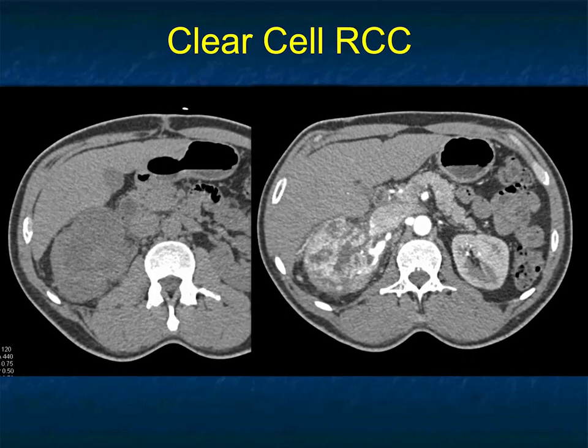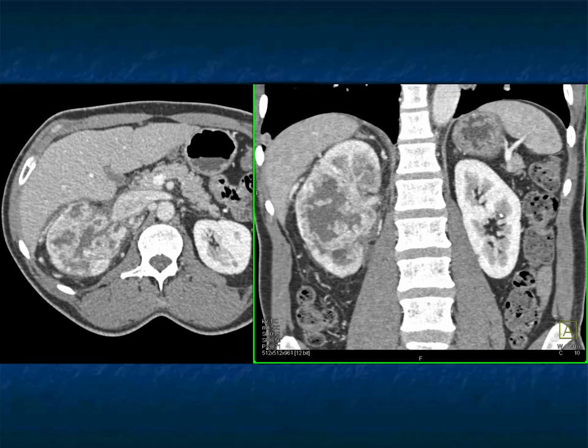Simple example, non-contrast scans, lobulations in the right kidney, and there you see a very vascular mass at about 30 seconds post-injection. Very classic for clear cell renal cell carcinoma. The corticomedullary interface in the contralateral left kidney looks normal.